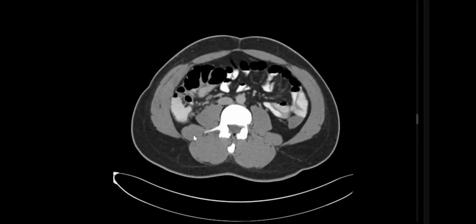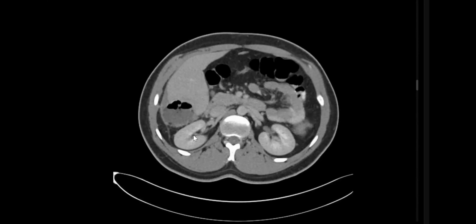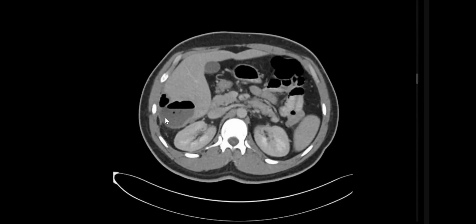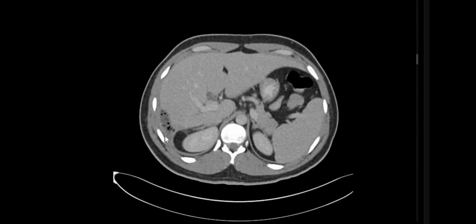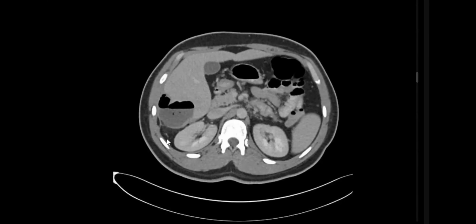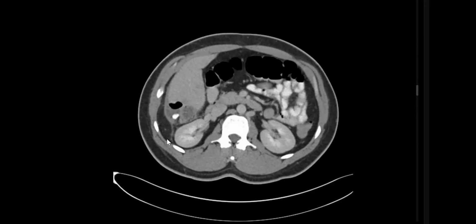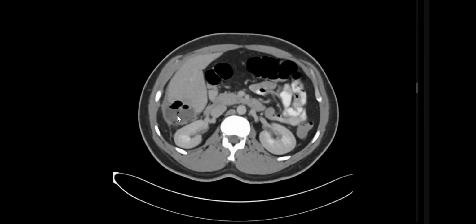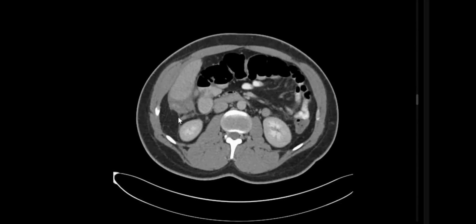So now the findings are likely suggestive of appendicitis with subhepatic abscess formation. Yes, it's ruptured tip appendicitis with subhepatic abscess formation. Again, drainage will be the optimum pathway. So the surgical and interventional radiology team: drainage of the abscess together with medication and elective appendectomy.